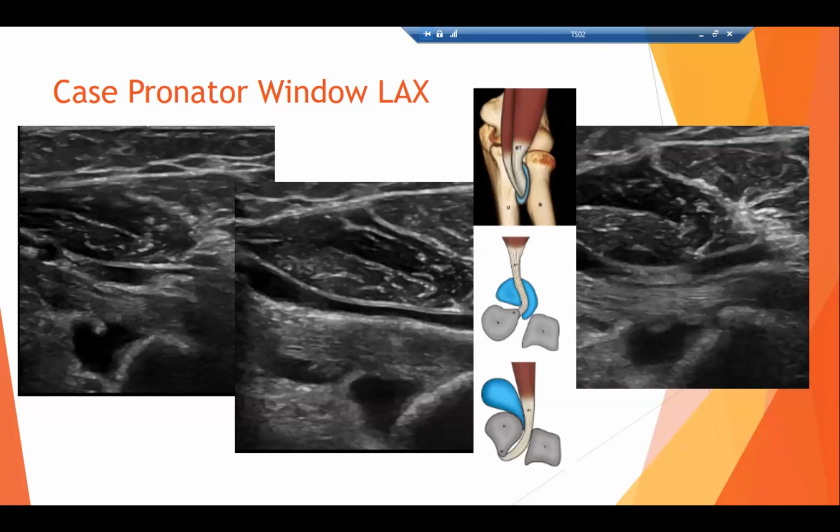And I just want to mention from this case that one of our goals is to come up with the cause of why someone has fluid in the bursa, and in this case, I think the cause was identified, and my experience is exactly the same. Distal biceps tendon pathology, far and away in my practice, is the most common cause of identifying fluid in the bursa, with all those other causes far down on the list. But if I was in a rheumatology practice, for example, those numbers may be different.